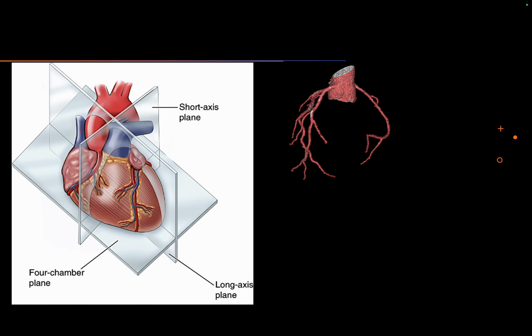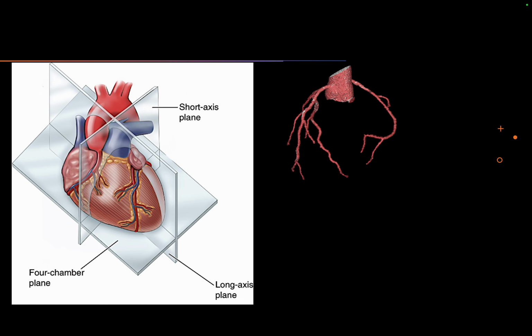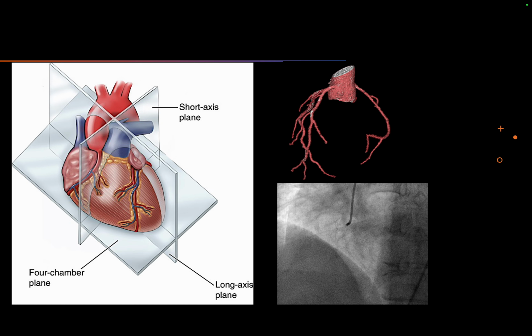Coronary arteries are three-dimensionally placed, so they cannot be seen in a single plane of echocardiography, as compared to a single plane visualization in a coronary angiogram, because they are superimposed head on. So you can see all coronary arteries in one go, whether you're doing a two-dimensional cath angiography or even a three-dimensional angiography, but you see things in a single plane.